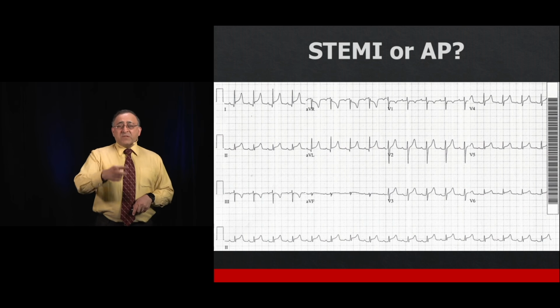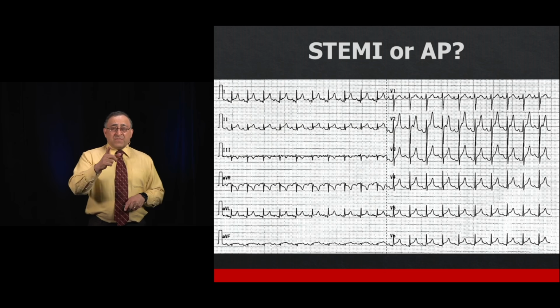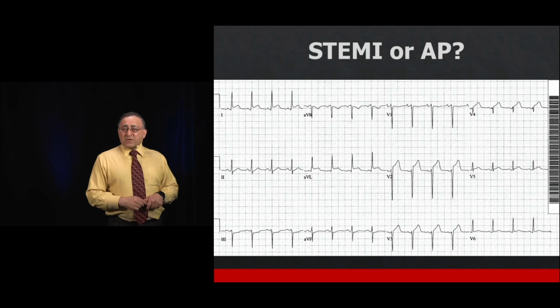All right. Now, with this case, fortunately, we had the prior EKG, but if this were the only EKG that we had, we'd kind of be out of luck. All right. Moving forward, here's a great case.